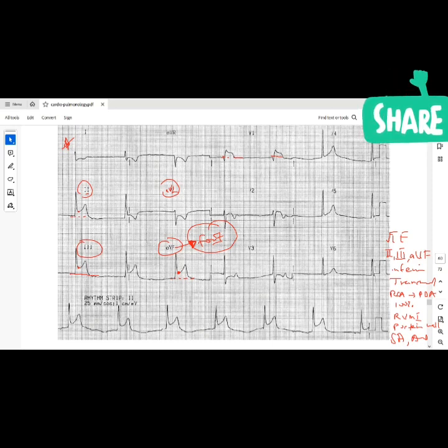So tell me, how will I determine on this ECG if the nodal cells are impacted or not? What can I look for on this ECG to tell me if the SA node or AV node is impacted? I guess the blood supply. What will you look for on this ECG? What will I look for to tell me if the SA or AV node is impacted? What does the SA node do? What's the function of the SA node?